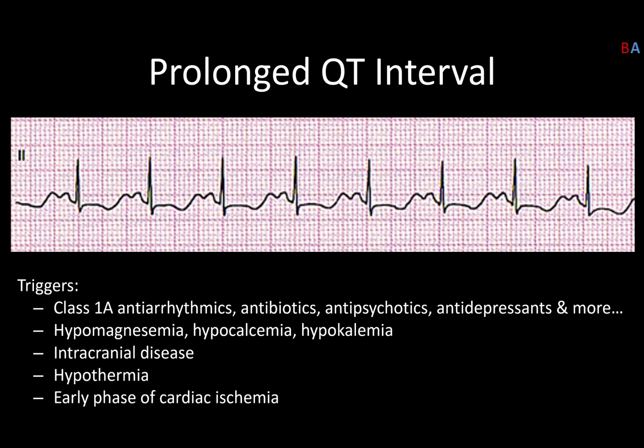We'll take this one right here because the QRS starts right here on a bit of a solid line and the T wave ends somewhere over here. In fact, this is the P wave, this is the QRS, and way out here is the T wave, and then the next P, and then the QRS. So that T wave is way out here, and it actually mixes with the next P wave, so it's really impossible to tell where one started and where one ended. So we just kind of strike the average and say that it probably stops somewhere around here.